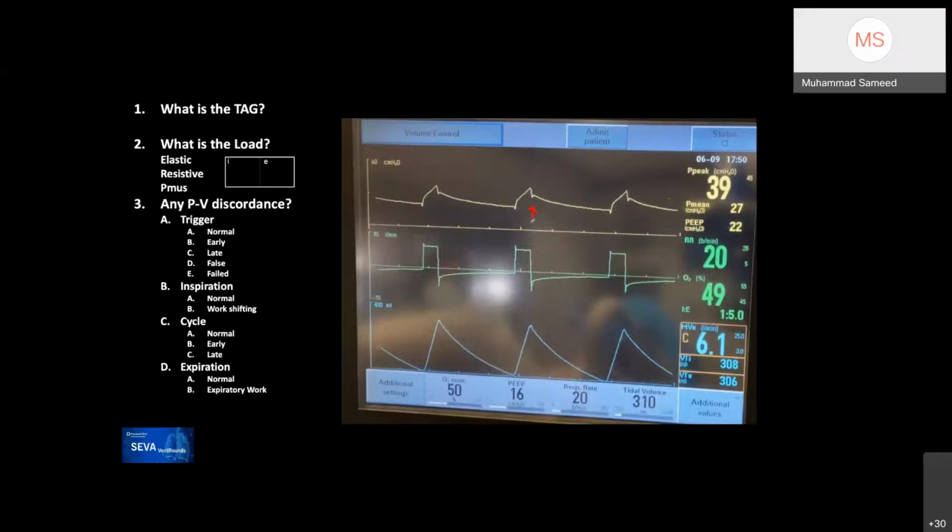And if you look at the expiratory phase on its own, it's not very exponential. It's more of a plateau than an exponential exhalation. So I would wonder what's going on during the exhalation phase in the patient. Either there's some problem with the ET tube, or some problem in the patient's airway, or something in the tubing outside the ET tube, something that's acting like a semi-valve situation, slowly releasing the flow or something like that.